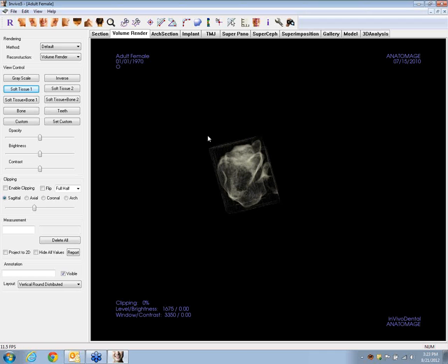By the way, I've been using a trackball for years. And a trackball, where you'd think it would be really great for doing this kind of thing, isn't really. It's kind of hard to do this. I find it easier for art programs and photographic things, but it's really hard for this sculpting.